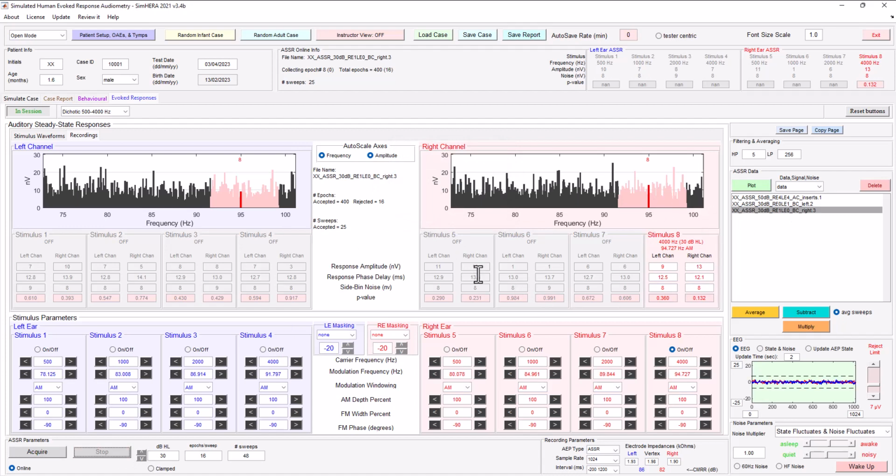Now, for the sake of time and brevity, I'm going to go to offline recording and just do the whole 48 sweeps. It will give you the similar end answer, but I do want you to go through and watch this updating and count your responses that are present and absent across the sweeps.